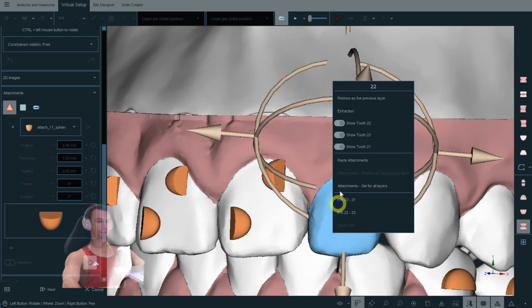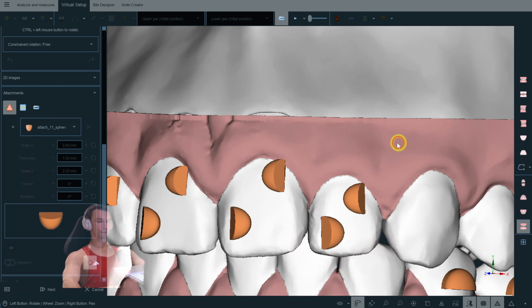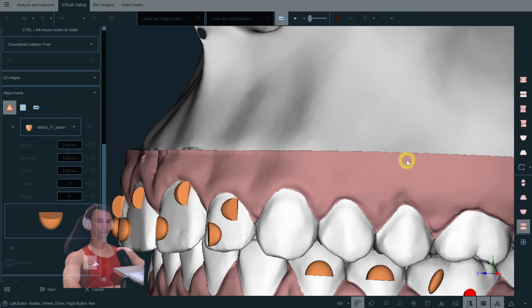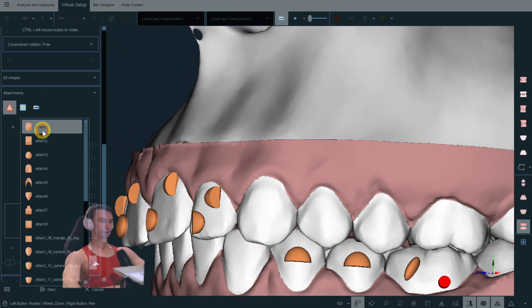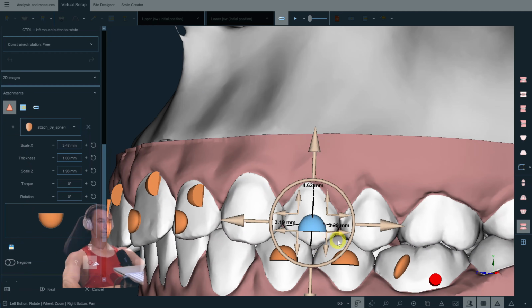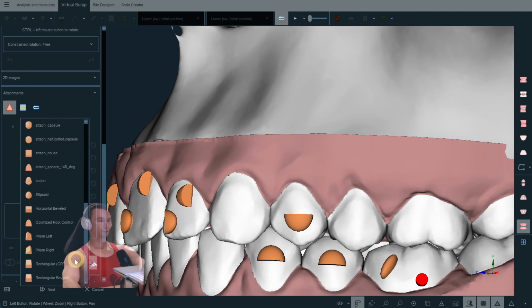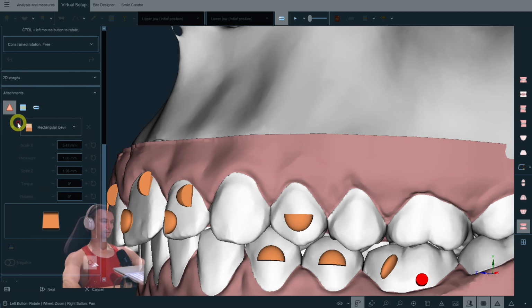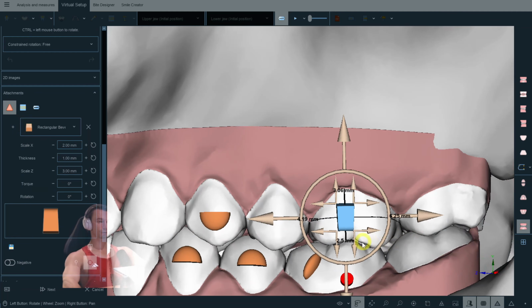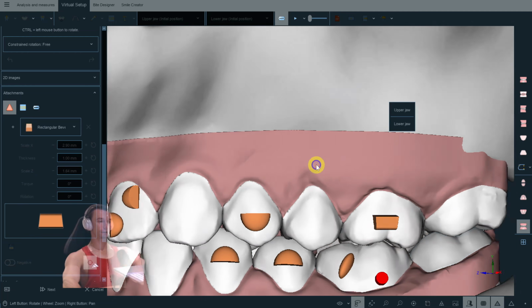I don't think so. I think we'll want them later at like layer 6 or 7. Let's check it later. And here we haven't done any distalization, so we need just the attachments for anchorage, and we'll use some standard attachments which will just help us to hold the aligner onto the surface of the teeth.